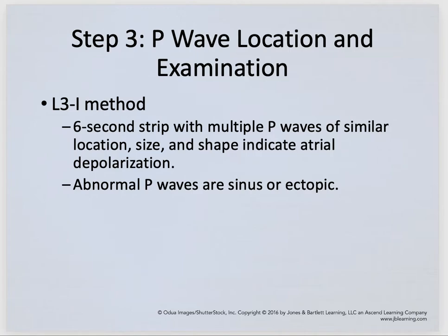If the P wave is abnormal, meaning it's an odd shape, it's happening not in a consistent manner, we would use the word ectopic or ectopy. It means that it's not being paced from the SA node, and one of the other cardiac cells is getting excited and causing that ectopic, excited beat to contract the atriums. An early contracted atrium means the P wave is going to be a different shape, different morphology, different size, and have a different timing to it.